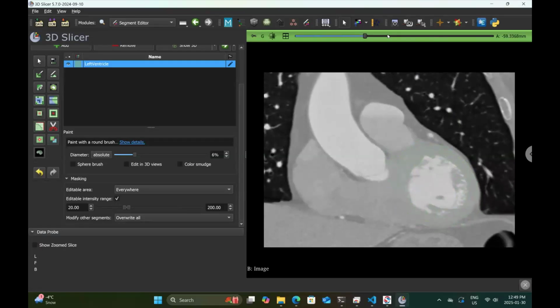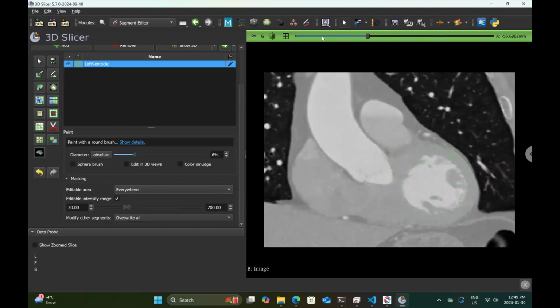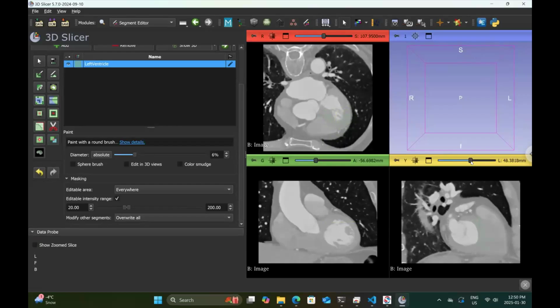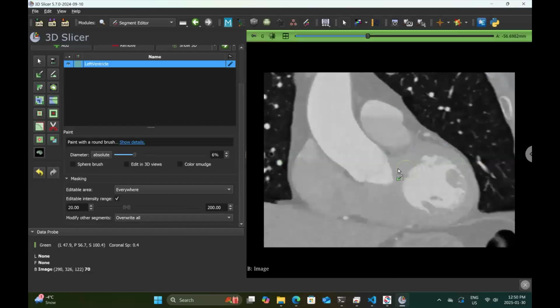Okay. We're almost there. We're almost at the aortic inlet. Halfway actually into the myocardium. Let's by now take a look at all of the planes. If you look closer into other planes, you can see the myocardium and the segmentation that we have been taking. It doesn't show the segmentation very well because you're doing the segmentation every 4 or 5 slices. So again, let's maximize this and continue the segmentation.